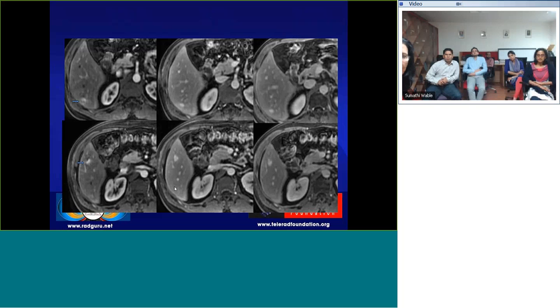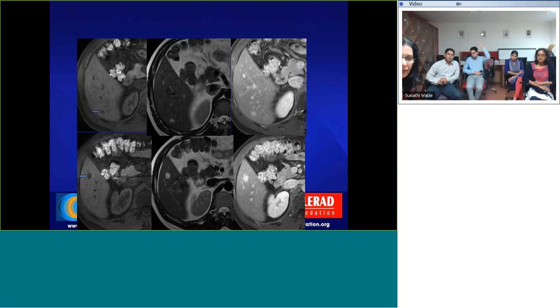And smaller hemangiomas can enhance quickly, the whole thing can fill up, but that's okay. But as long as they stay bright on the delayed images and they are very hyperintense on T2, like you saw, if they fulfill all the imaging criteria for hemangioma on MRI, you can still call them hemangiomas. The problem becomes when they don't.